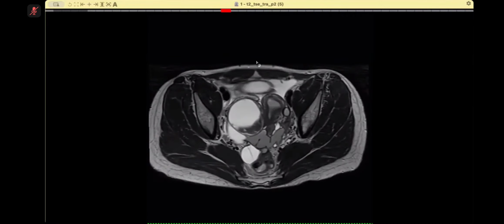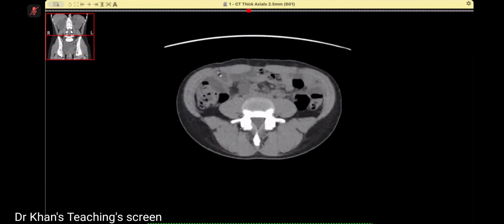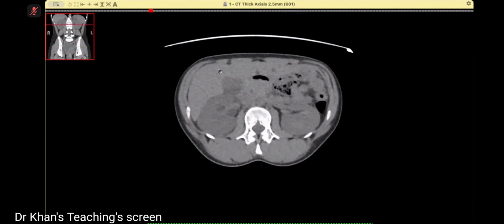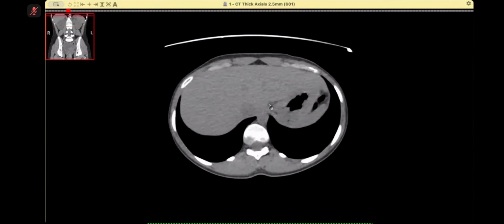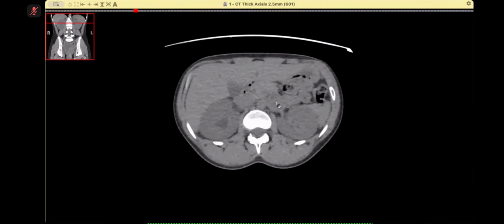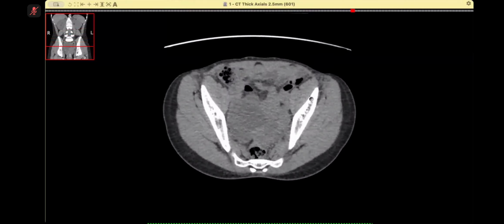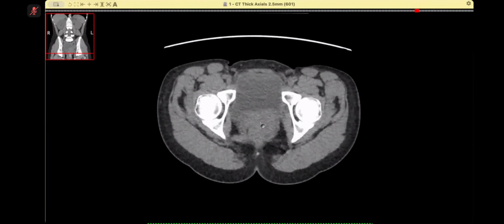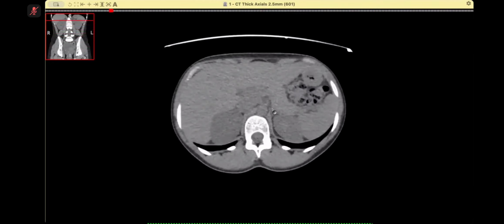Okay, just stop. I'd like to see the T1. Let me take over. So this is the second last case of the day, and we've got another case to go. This is deep pelvic endometriosis, and the point is that on a CT scan, it was fine because there was hydronephrosis and there was cyst and things like that. Now, in a young patient, go for MR.